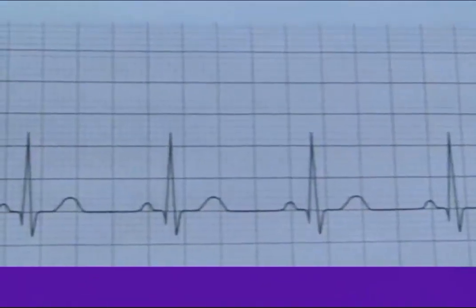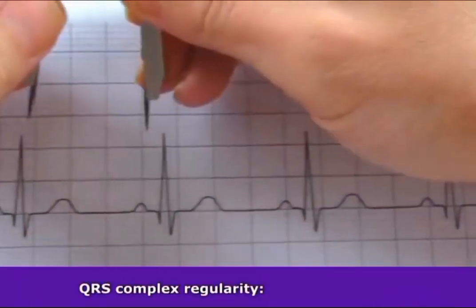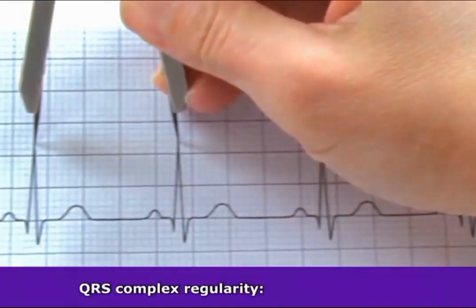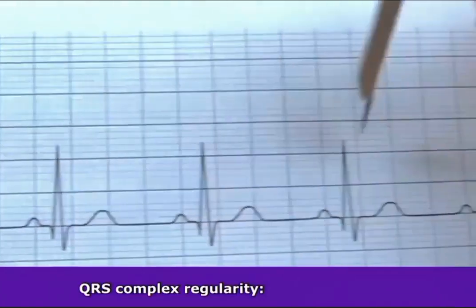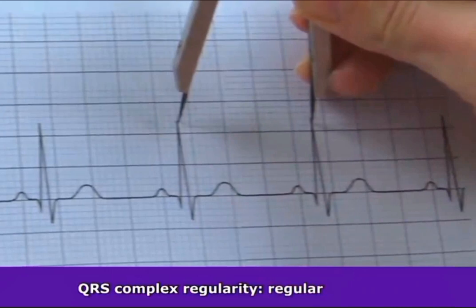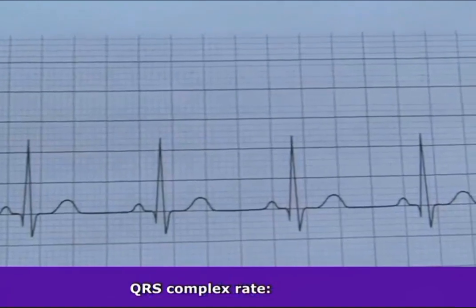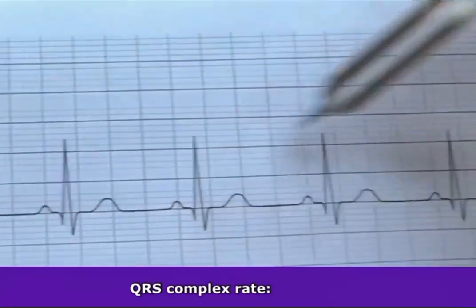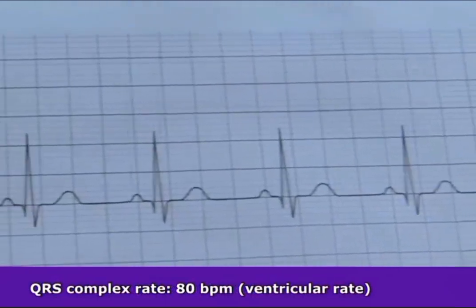Now let's look at the QRS complexes, the 3 R's. So first, regularity. So just like with the P waves, we're going to take one end of our calipers, put it on the R wave of the QRS, and then put it on the other R wave of the QRS, and then just track it down through the strip, making sure that they line up together and that they are regular. And so far, they look regular and they are regular. Next, let's count the rate. So count each QRS complex and then multiply by 10. So we have 1, 2, 3, 4, 5, 6, 7, 8. So 8 times 10 is 80. So we have a ventricular rate of 80, just like the atrial rate.